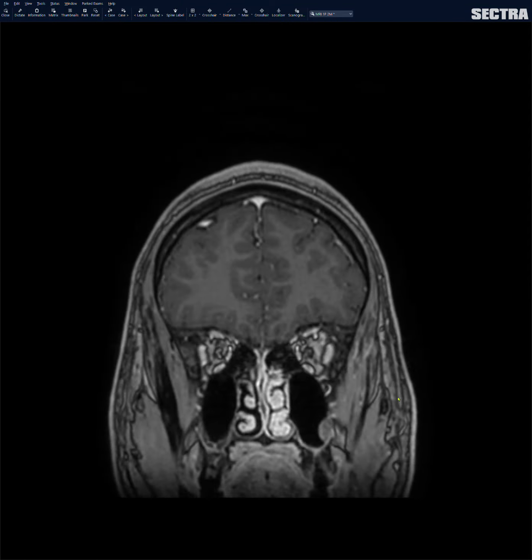Over here is the 2D post-contrast. So let's compare the 2D with the 3D. This is the 3D down here. This is the 2D up here. So the 2D is actually done at a later time point than the 3D. So if you're looking for enhancing metastasis, you actually have more time for these metastases to soak up contrast on these 2D images than on 3D images. So sometimes you can see an enhancing metastasis on the 2D that you don't see on the 3D.